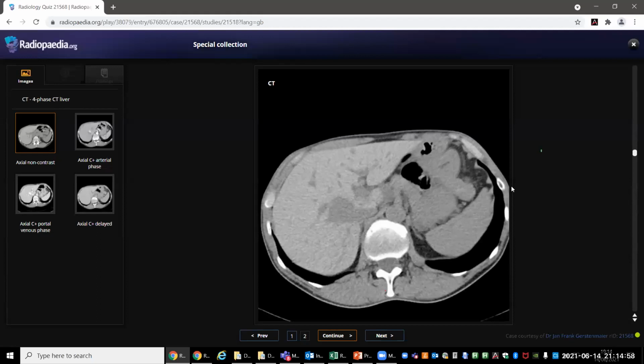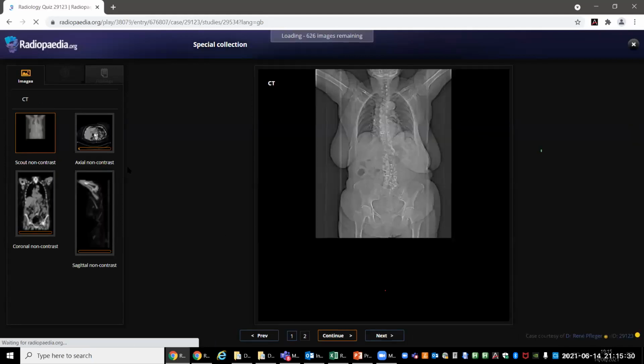That points towards, ma'am, that the patient is having hemochromatosis manifest as some sort of iron deposition in the pancreas also. Okay, what type of hemochromatosis is that? Ma'am, this is congenital or hereditary. Okay, that's fine.